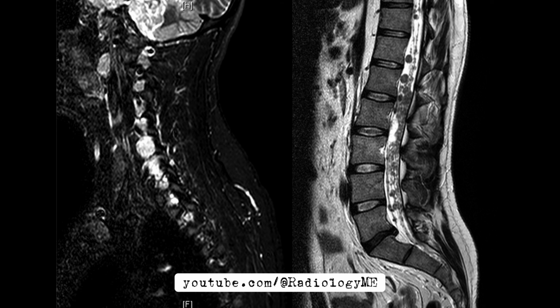Another key feature of NF2 is the involvement of meningiomas, which can present as intraventricular or interhemispheric lesions, as seen in this case. These tumors can exert mass effects on surrounding brain structures, leading to a variety of neurological deficits, depending on their location. In the spinal cord, NF2 can present with schwannomas or ependymomas, which may cause neural foraminal enlargement and compressive symptoms along the nerve roots.